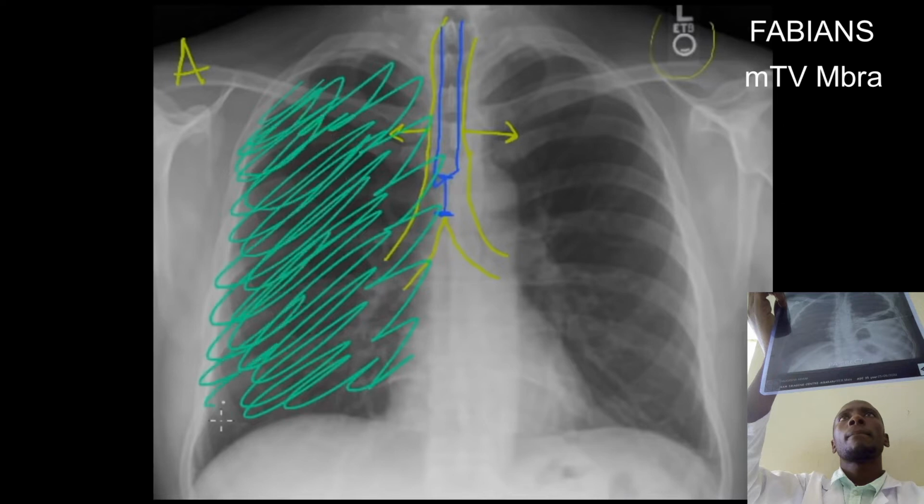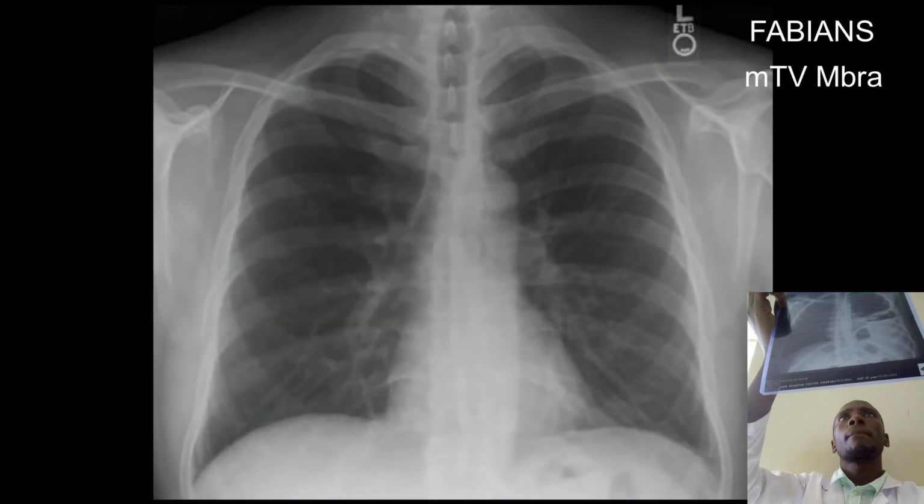For example, if someone has pleural effusion on the right side of the lung, this side I'm shading with green represents the right lung, because there is air, and as you can see, the color is black. When there is pleural effusion on this side, it will push the trachea towards the other side, the left. So you will know when you have an X-ray. That was the trachea.